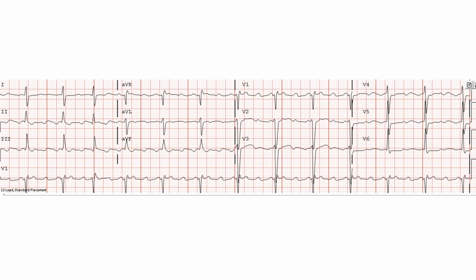What else? You have LVH with right axis. It's simple. So to summarize it, this patient has atrial flutter, mostly 3-to-1 AV block. She has Cornell criteria for LVH based on S in V3 plus R in aVL about 20 millimeters. Her QRS is about 110 milliseconds, and it's likely QRS widening related to left ventricular hypertrophy. She also has a right axis deviation. So LVH with right axis deviation, inherently it's biventricular hypertrophy.